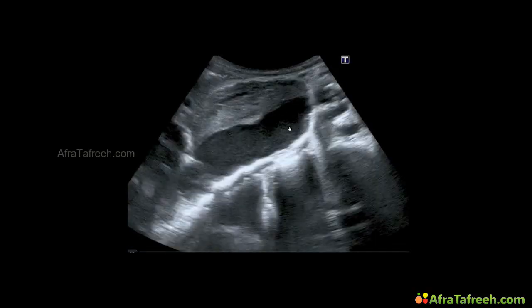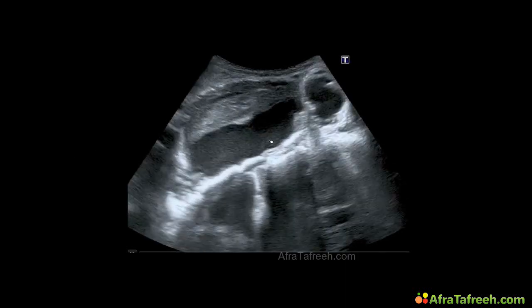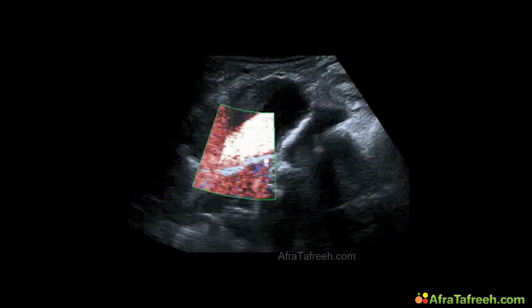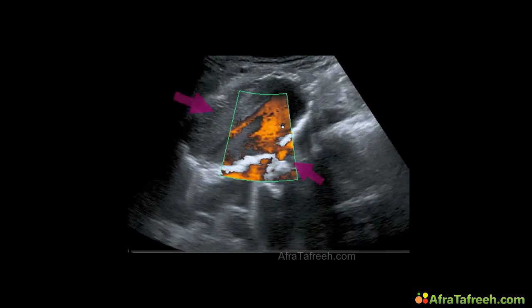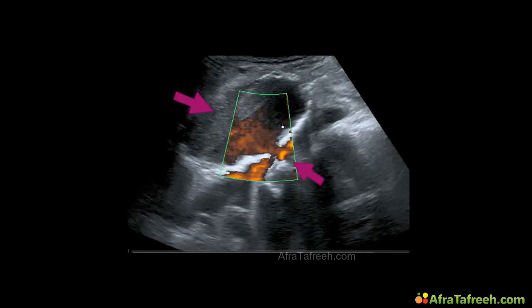So here we see the abdominal aorta, and there's something wrong with it. And then the next clip, we see also the color Doppler. So there is a great abdominal aortic aneurysm. So I interrupted him and said, "Oh, this mistake maybe saved the life of this patient. The patient has an aneurysm of the abdominal aorta, size greater than 5 centimeters in diameter. So there is an indication for vascular repair to avoid a sudden rupture."